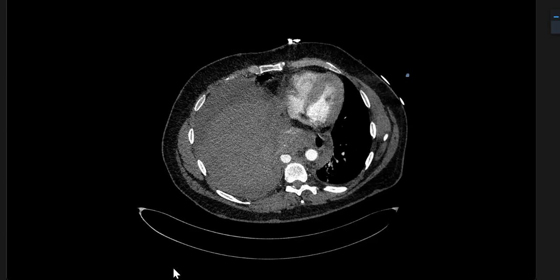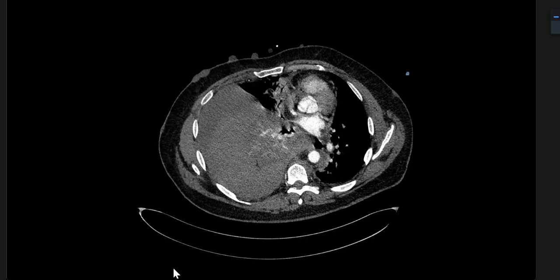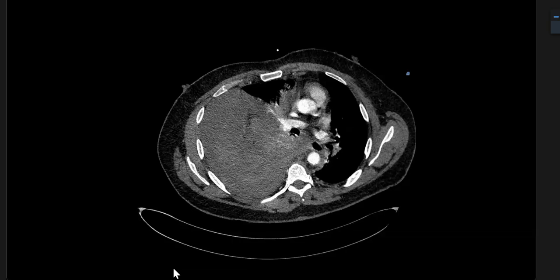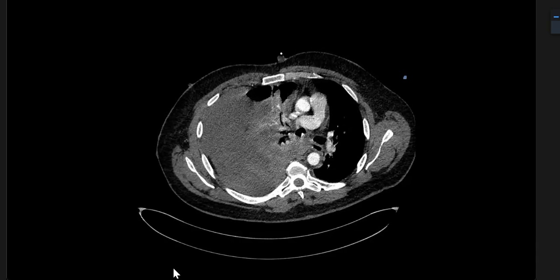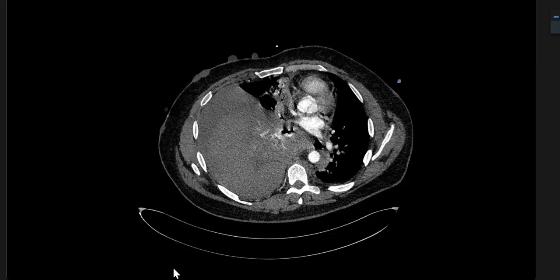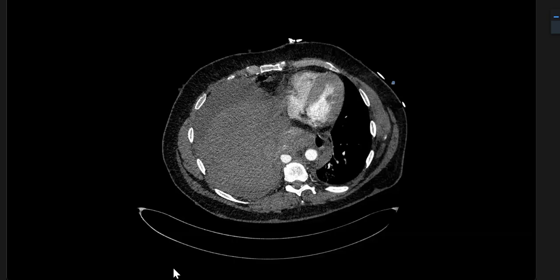So in these post-contrast images, I can see there is underlying collapsed lung, and there is no discrete mass seen. However, the right upper lobe bronchus appears normal. The middle lobe bronchus appears normal. The right lower lobe bronchus I could not see adequately. Possibly there is some element of collapse in the right lower lobe.